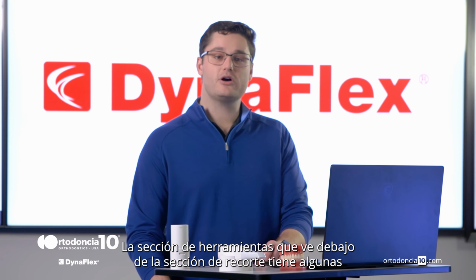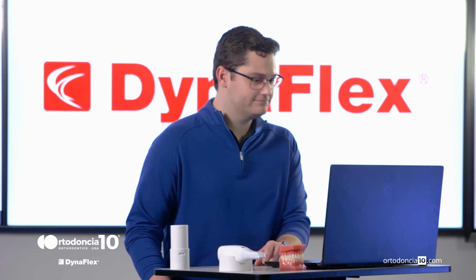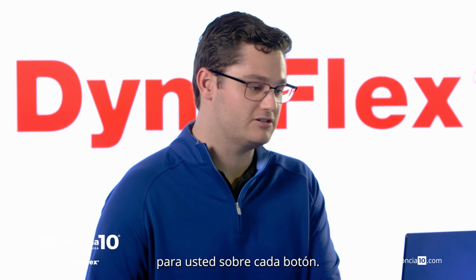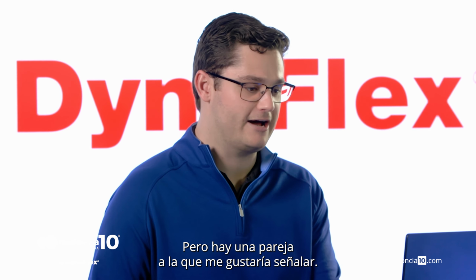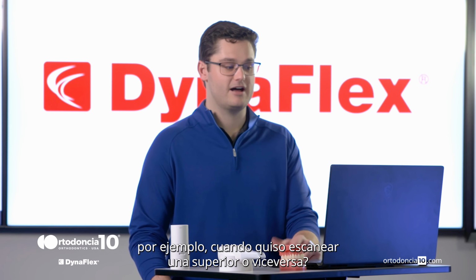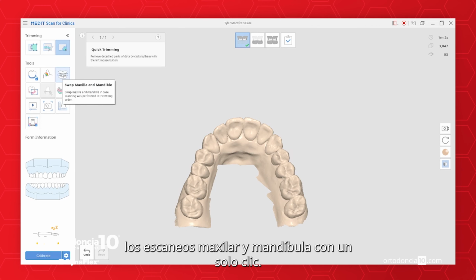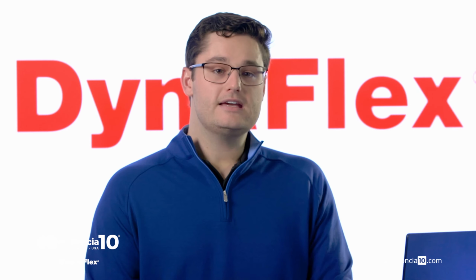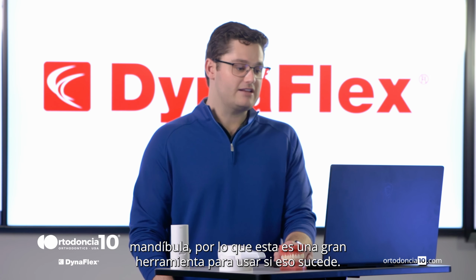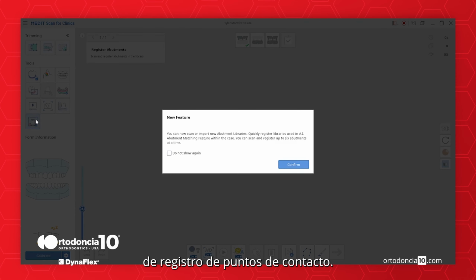The tool section you see below the trimming section has a few features and custom controls that help you get further detail. Most of these are very self-explanatory and have great descriptions if you hover over each button, but there's a couple I would like to point out. If you accidentally scan a lower, for example, when you meant to scan an upper, or vice versa, the third button on the right allows you to swap the maxilla and mandible scans with one click. It's easy when starting out to forget to click the mandible image, so this is a great tool to use if that does happen.